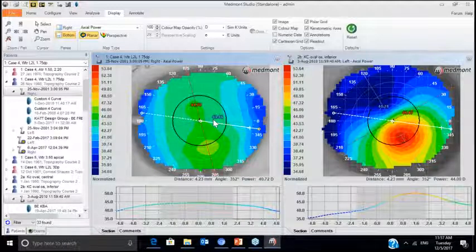Now, this is really wild. If you look at the flat meridian of this patient, 43.46 by 44.79, there's approximately 1 1/4 diopters of corneal astigmatism. Now let's take our very advanced keratoconic patient and look at the K readings, 44 1/4 by 45 1/2 roughly. So there's 1 1/4 diopters of corneal astigmatism in both these eyes.